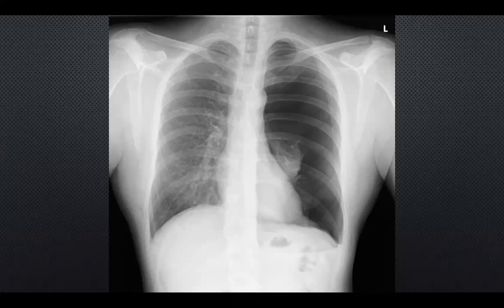Yeah, exactly. And you know what, in this case, I would also jump straight to the diagnosis. It is a large left-sided pneumothorax. It's obvious. You guys are obviously very good. I probably gave you two easy cases, but what it means is that you've said it's a pneumothorax, but in terms of a pneumothorax, what then would you go on to look at to make sure?